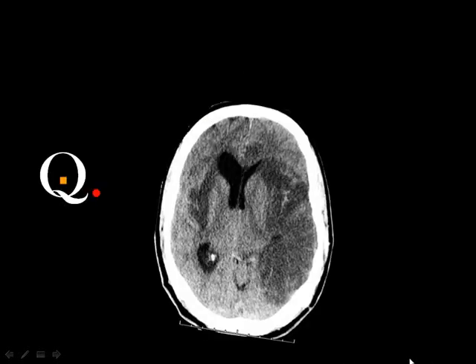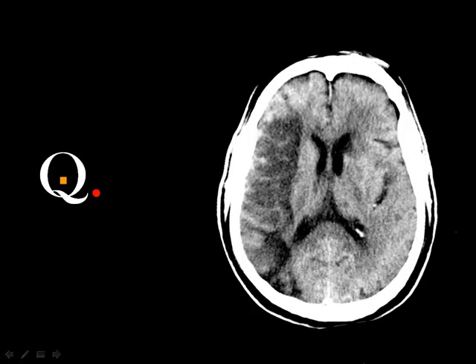What do you think of this? Left infarction, acute, right? Chronic. Actually, this ventricle is compressed, then you know that this is acute infarction. But you don't know if this ventricle is normal, because the patient had some atrophic changes, or if it is dilated secondary to the presence of this area. Then we consider, if they have the same density, both as acute infarction. Okay. Then what do you think of this?